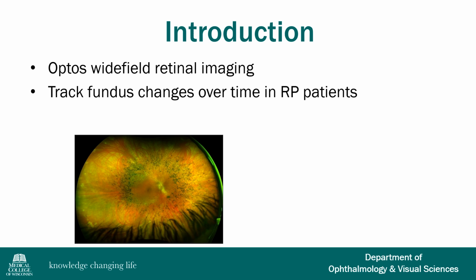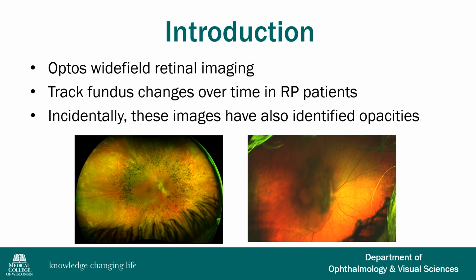This brings us to the Optos Wide Field Imaging System, which at our institution's Inherited Retinal Disease Clinic is used as a standard diagnostic tool to track fundus changes over time in RP patients. Observation was made with regards to an incidental opacity that was commonly encountered and was initially regarded as artifact. With acquisition of more of these photos, it was noted that the opacity is correlated to the size and shape of PSC cataracts as seen on slit lamp exam. An example of such an opacity can be appreciated here on the photo on the right.